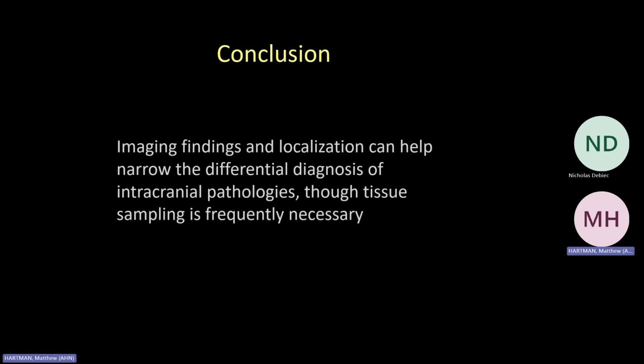Remember, there is an approach, just like all our other modalities. And for neuro, it's very important to know the anatomy. It's important to know how the study was done, and hopefully that was helpful reviewing the differences with the different sequences for MRI. Again, the T1 with contrast, T2, the FLAIR, and then the diffusion. Identifying the lesion or lesions, trying to decide if it's intraaxial or extraaxial, looking for those ring-enhancing lesions. We've got some great differentials, and then looking for those ancillary findings. Is there hydrocephalus? Is there herniation? Is there hemorrhage?